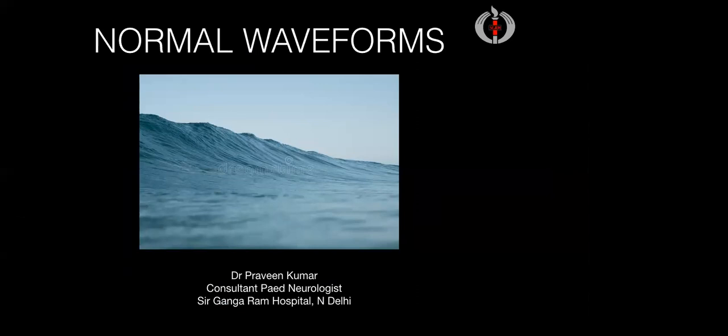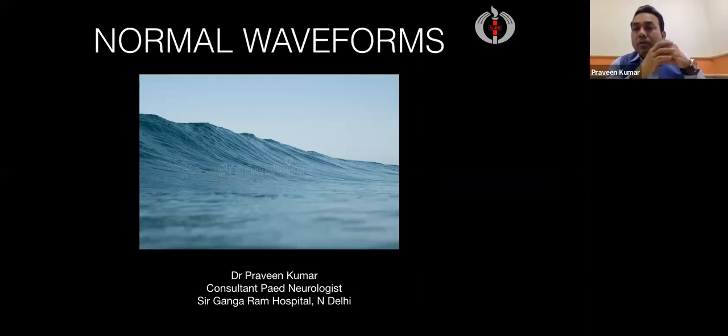Yes. Please go ahead. So, we'll start with the EEG waveforms. I think the most curious and interesting part whenever we come across EEGs in our ward rounds is that all our residents, the PGs, everyone asks, "Sir, what is visible in this? What do we see in the waveforms, where are the abnormalities?" Our mind always goes towards the abnormalities, where things look abnormal, where spikes are seen.